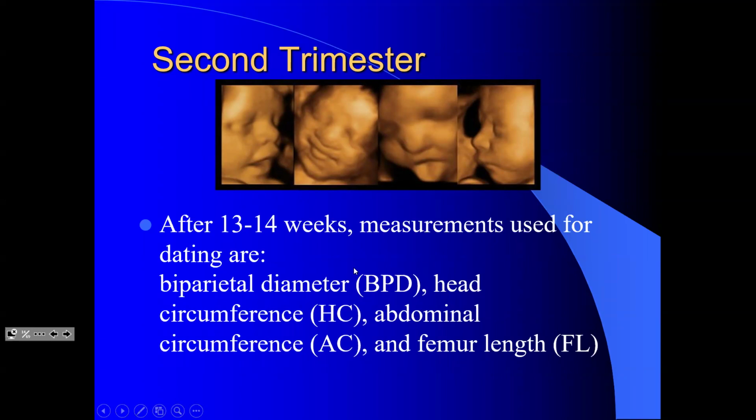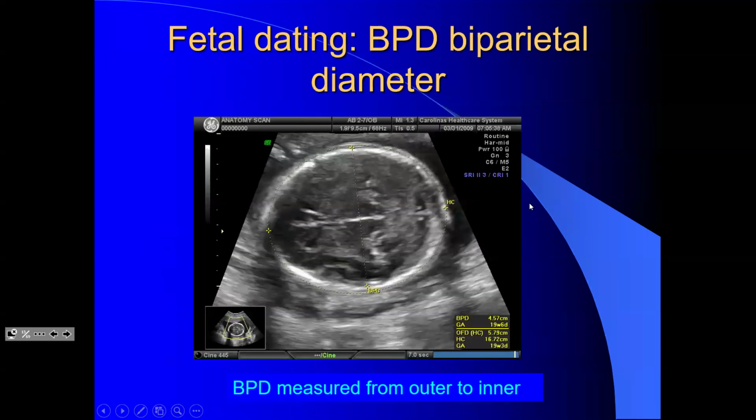So these all tell you, if you measure them, the machine automatically would tell you what is the corresponding age. These ages are average ages that they have calculated. They are already fed into the system, so they automatically tell you the rough age. Like if you give the machine the femur length of the fetus, it will tell you, for this length, how much is the age. Okay, so let me show you examples.